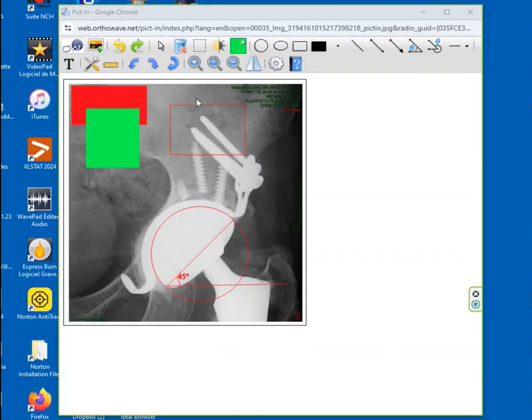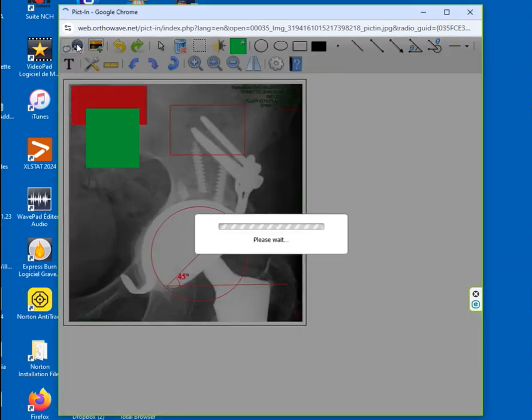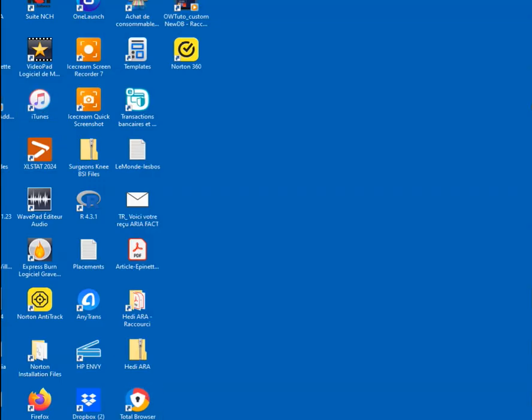All actions on the displayed image are possible, such as selecting areas of interest, choosing colors, adding texts, geometric figures, locating the center of circles, calculating angles and distances by scaling the image, also inserting other images or comments. At the end of processing, the image obtained can be added to the catalog of initial images.